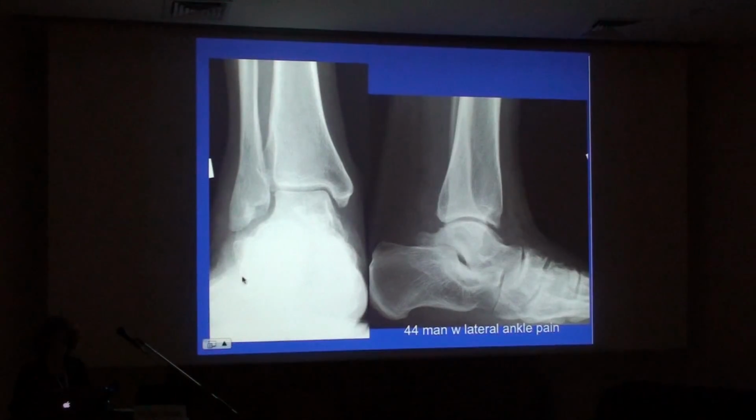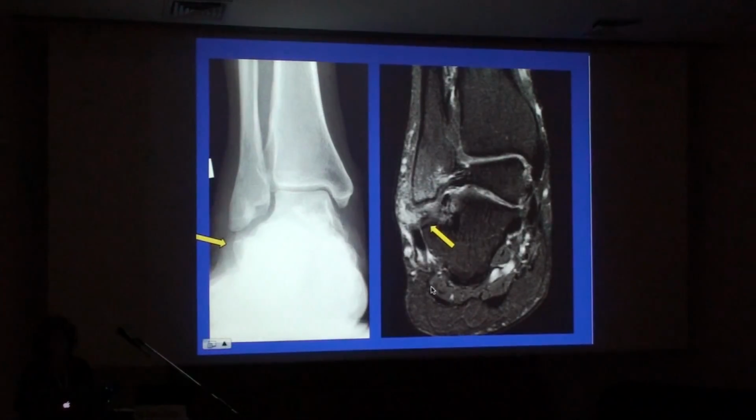right? So he has this bump here. He has weight-bearing fibula, which is bad for him, and you can almost see the bump right here. So this is a patient with flat foot deformity as well as a giant peroneal tubercle. He's forming a pseudofacet with the fibula. He's entrapping the soft tissues here. So you have the calcaneal fibula sitting there and the peroneal tendons sitting there. So you have extra-articular impingement as well as a hypertrophic peroneal tubercle.